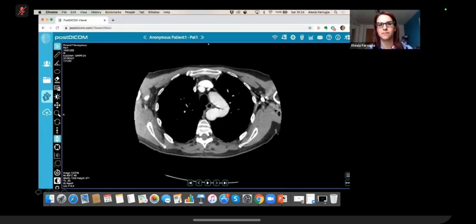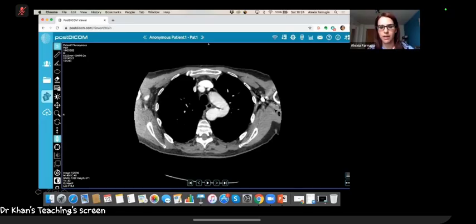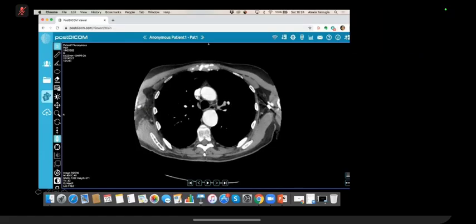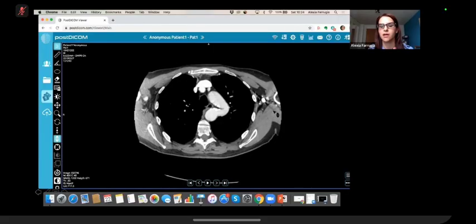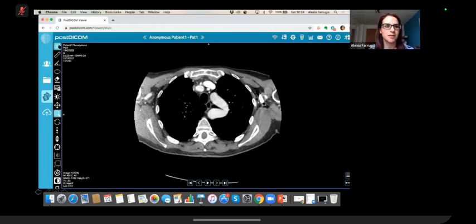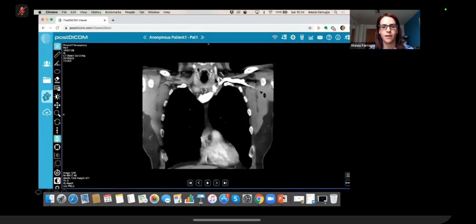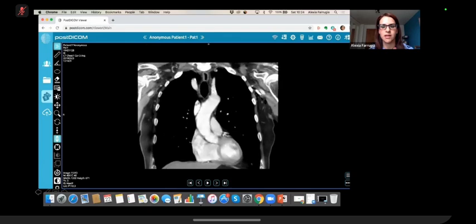It has this slightly curvilinear structure between the ascending and descending aorta. I'm looking for any calcification or dissection flaps. Okay, can you see a dissection flap? I can't see one, no. No, okay. So in my routine practice, I'd have a look at this on coronal and sagittal to further evaluate. We have a coronal for you. I will scroll through that as well.